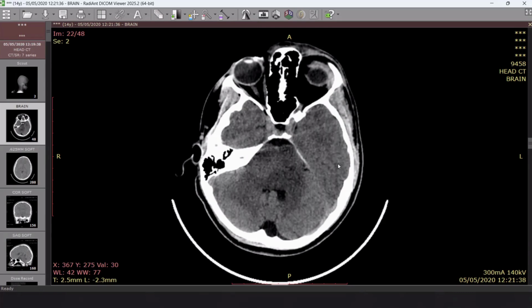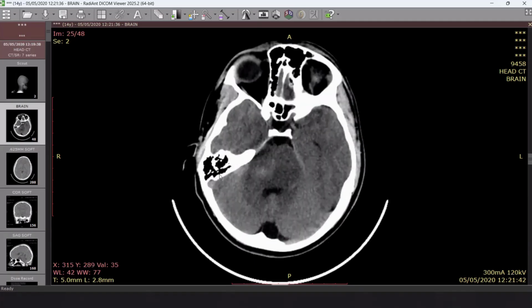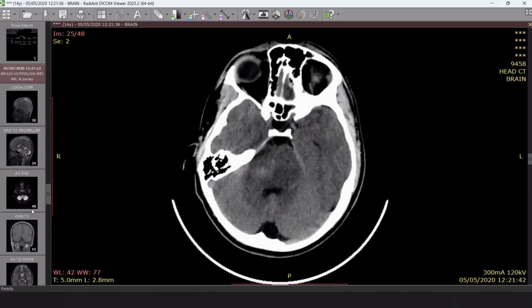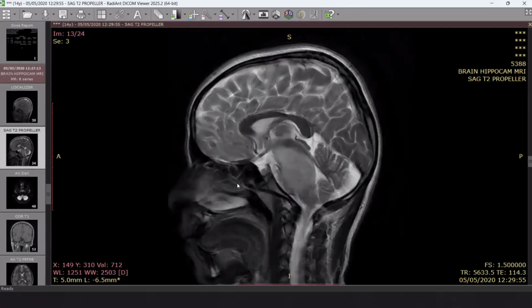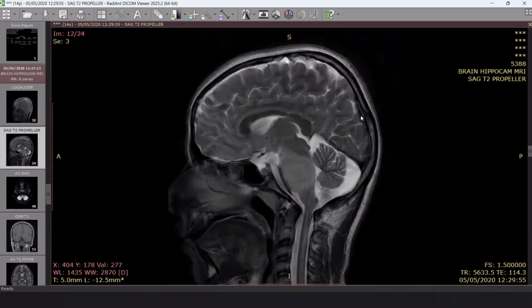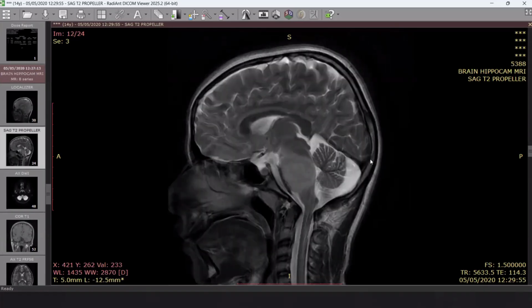Which type of tumors do you think? Round cell tumors, the ones that arise mostly from the posterior fossa and the brainstem. This one could be a diffuse glioma. The mass is hyperintense on T2. There are no cystic changes within it as well.